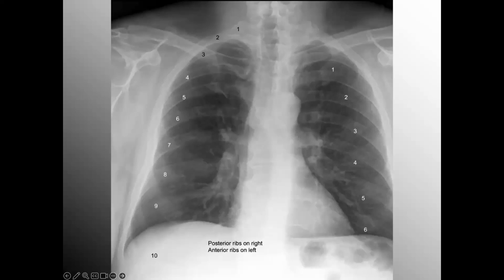In the frontal view, also known as the anterior plane, only 10 ribs are technically present. Ribs number 11 and 12 are floating ribs, and they really do not enter the frontal portion of the body, right? I mean, remember, anatomy, anatomy, anatomy. The average radiologist probably knows as much of the anatomy as would an anatomist. They have to in order to identify all potential abnormalities, right?